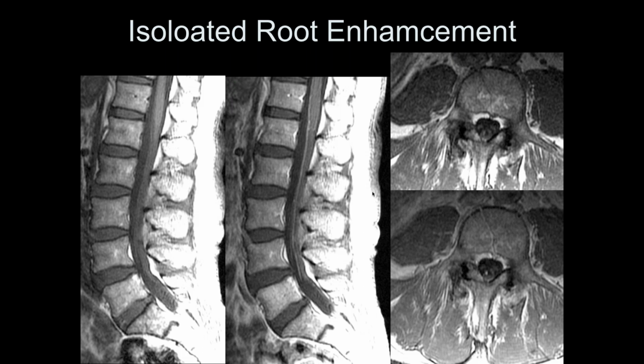Right. So one time people looked at this and they thought this indicated neuropathy and an abnormal nerve and a potential source of pain. We've since found out that this enhancement is quite common, even in people who don't have symptoms, who are getting it for other reasons. So at this point, it's kind of unclear what enhancement means along the root like this. Post-op, you can have it, with this kind of benign stuff. Right. Don't do much.